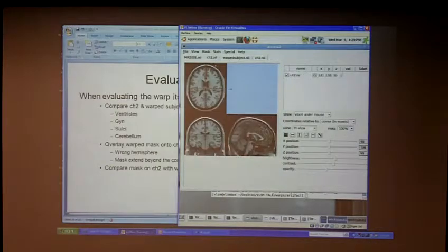What happens if I'm trying to figure out each step, what it would look like if it doesn't work well? So what does it look like if the ventricles don't look good? It will look closer to the actual patient's ventricles. Oh, really? So it will be large like that? Exactly. So you will see the large distortion in that way. Okay.